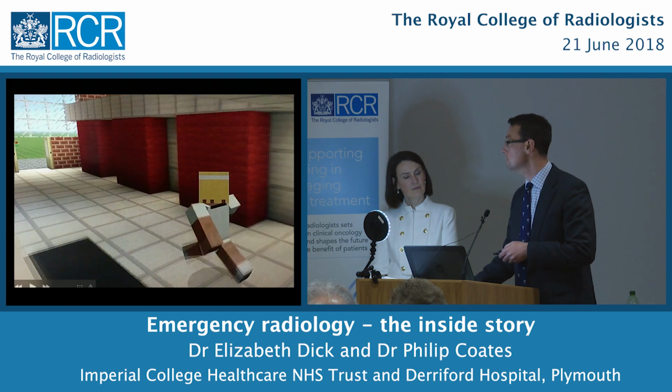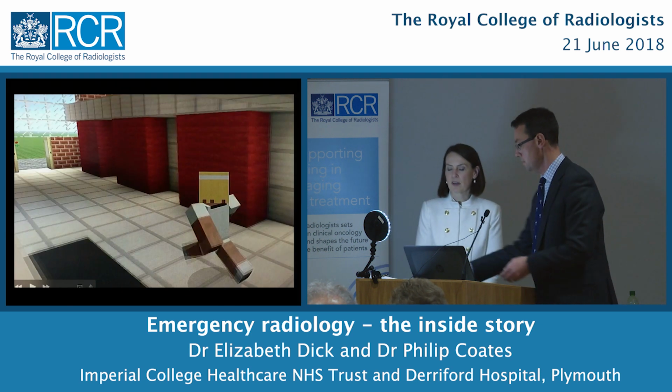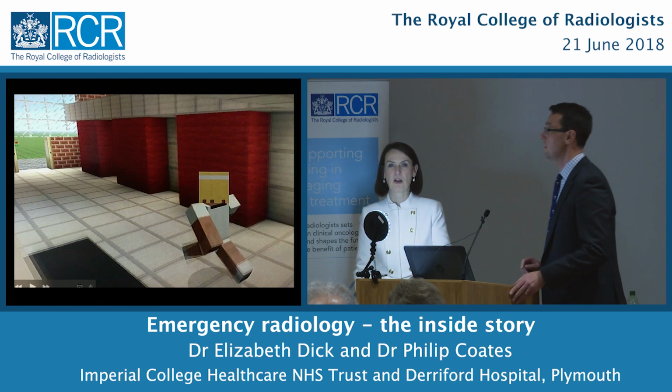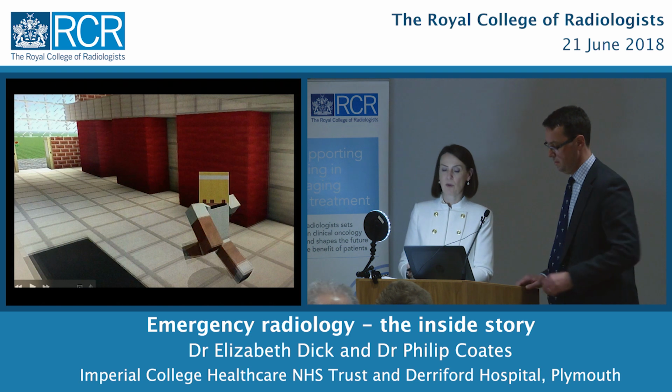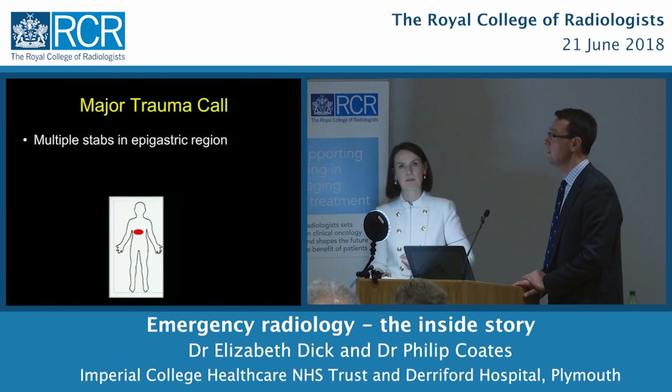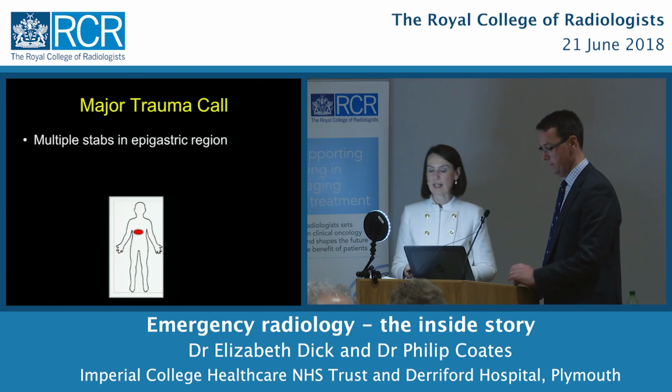Okay, what's coming next, Elizabeth? Okay, so 3 o'clock in the morning, as all of my registrars know, is time for stabbings. So the next patient is a patient who has been stabbed. He's had multiple stabs, again in that upper abdominal region.